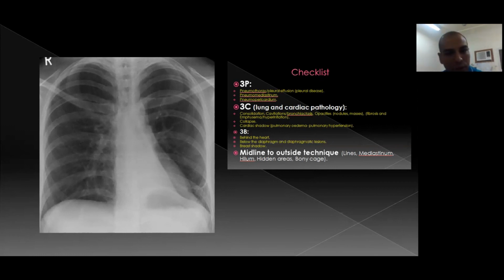If there is no one here, do we have any pneumothorax? No. Do we have any? Yes, Dr. Wael is here. Yeah, Dr. Wael, go on.